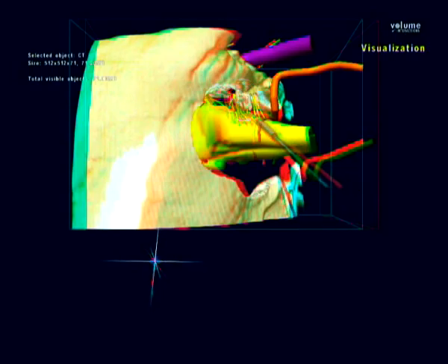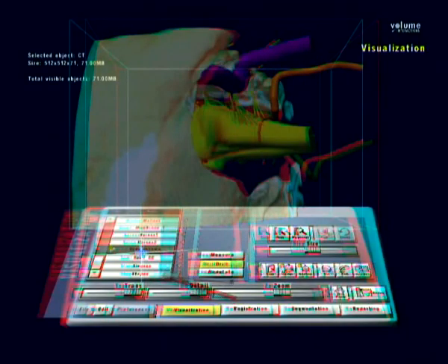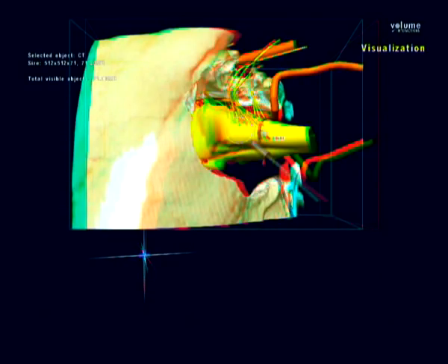Drilling is now taken a bit more superiorly to expose the cranial nerves in the jugular foramen. The sigmoid sinus and jugular bulb are now exposed, and they can be ligated and sacrificed to provide a very wide and extensive exposure of the lower brainstem, as seen here.